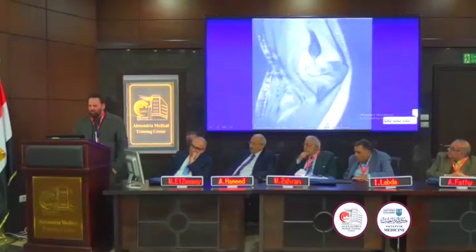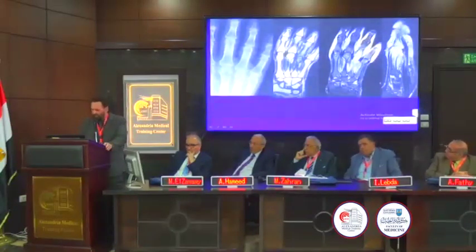Dirty joint effusion. We spoke about this in the elbow. So not only will you see an effusion, it should be heterogeneous with a visible synovium sign and perisynovial edema. Again, septic arthritis, uniform joint space loss, you see it? Marrow edema, again, secondary osteomyelitis, obvious enough that a first-year resident can see it.